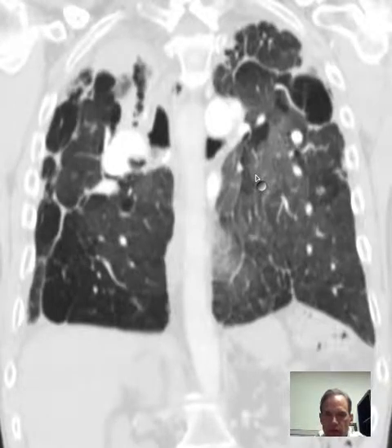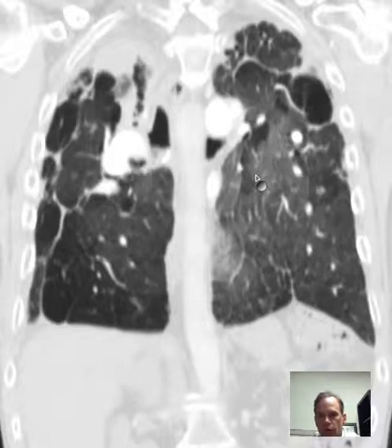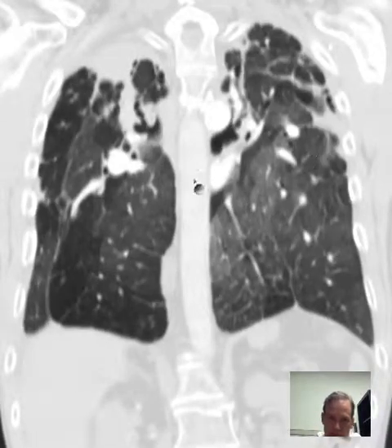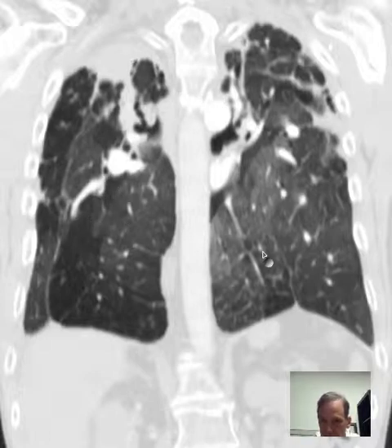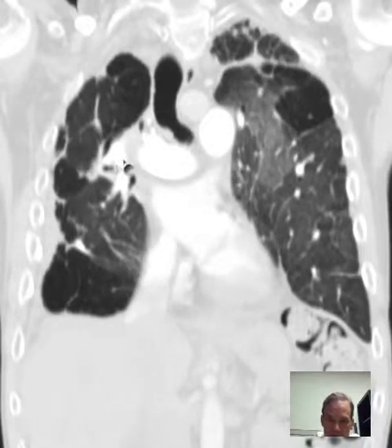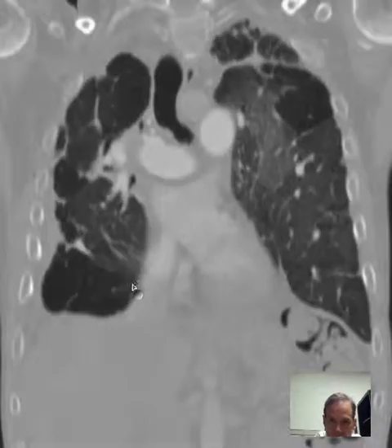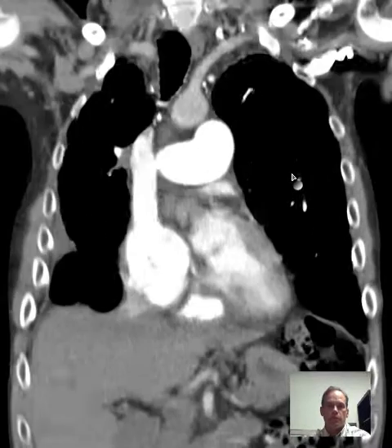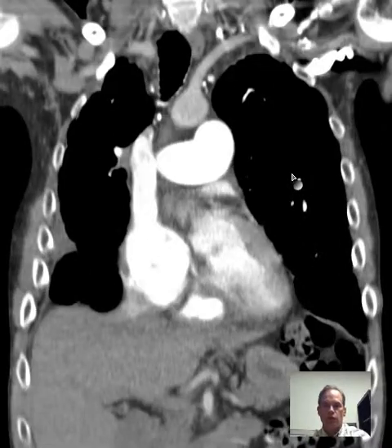And this is where having some familiarity with radiologic nomenclature and the way that we communicate with reports is important, because you can look at it and see this is abnormal here, and this is abnormal, and maybe this is abnormal here, and gee, these areas look too dark. This looks too dark. But you want to be able to describe it. Okay? So this is how I would describe it.